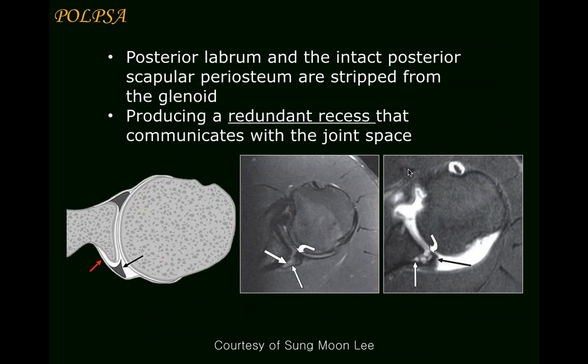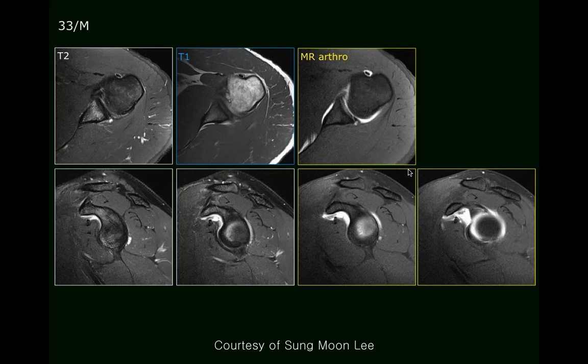Okay, and then these are just further posterior inferior labral injuries that we've been talking about.